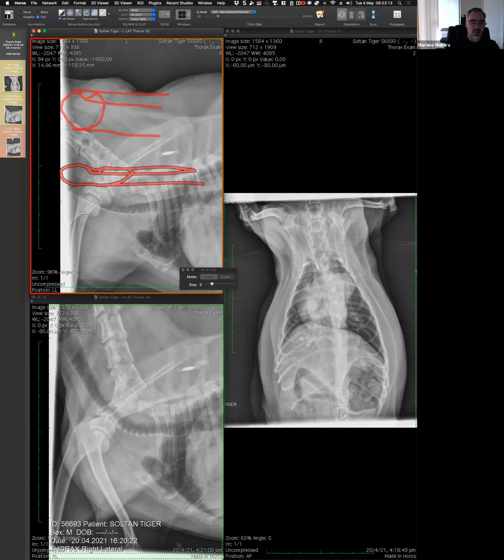There is another situation which is relatively uncommon, but is there, and probably a good differential would be a bleeding disorder, and then bleeding in the trachea, like rodenticide poisoning, and then there's going to be edema of the wall, a lot of edema, or if there's severe tracheitis, and then there's a lot of content in the trachea. So then you have thickening of the wall, and that is going to result in a very different appearance.